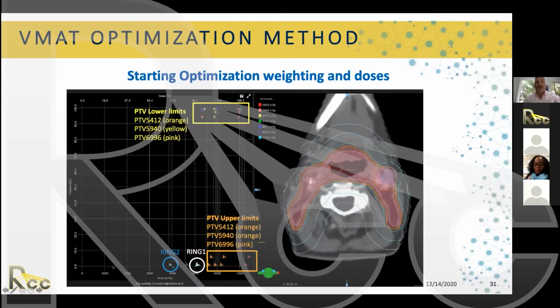I have a little graph here where you can see how we set all the lower limits in a head and neck case with 3 PTVs, or 3 dose levels. So you're going to have 3 sets of lower limits, depending on the PTV that you are constraining. In orange is the 5412, the yellow is the 5940, and the pink is the 6996.